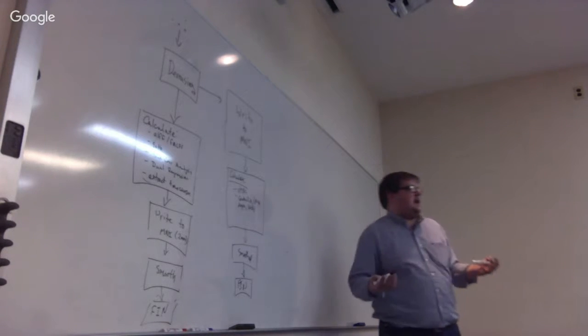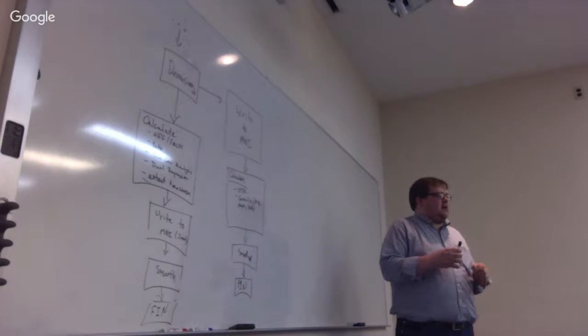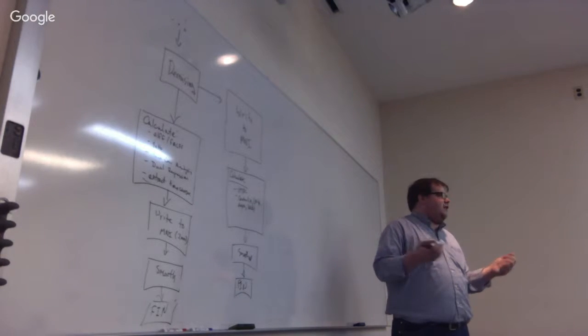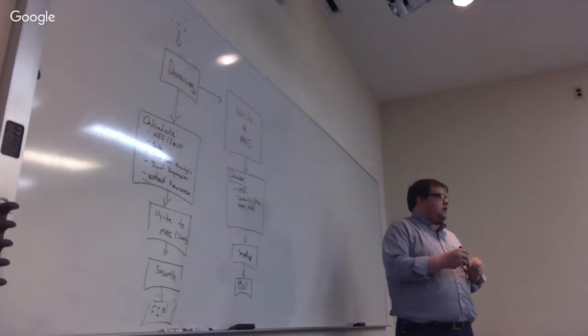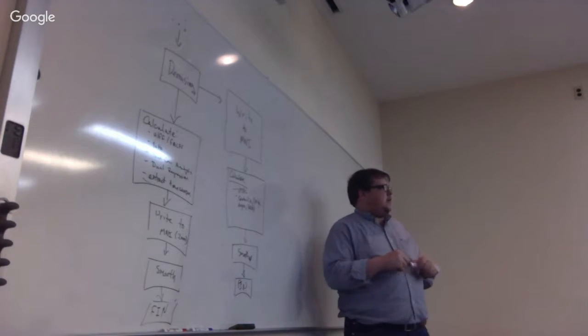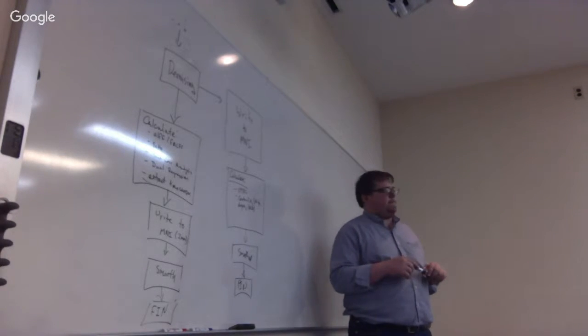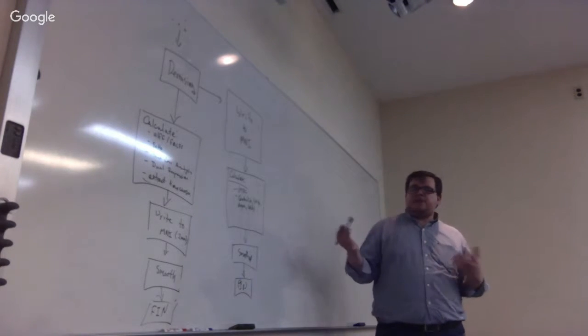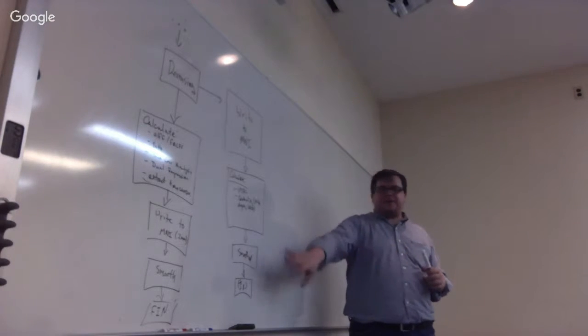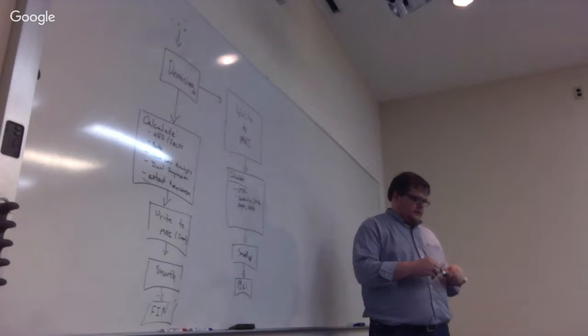Connections between, say, gray matter and the ventricles are, if they're there, artifact. We probably should try to avoid those. But also, they can take a really long period of time to calculate. So we want to restrict the number of voxels that we actually use in the calculation. So those are those things. And after we've done that, then we can do group analysis, right?